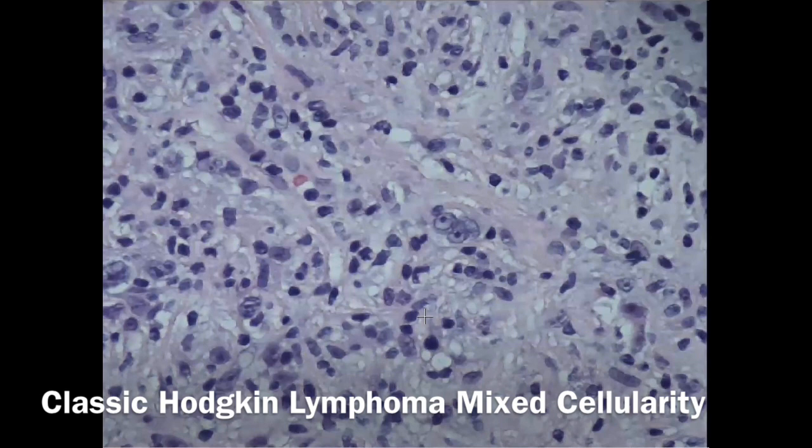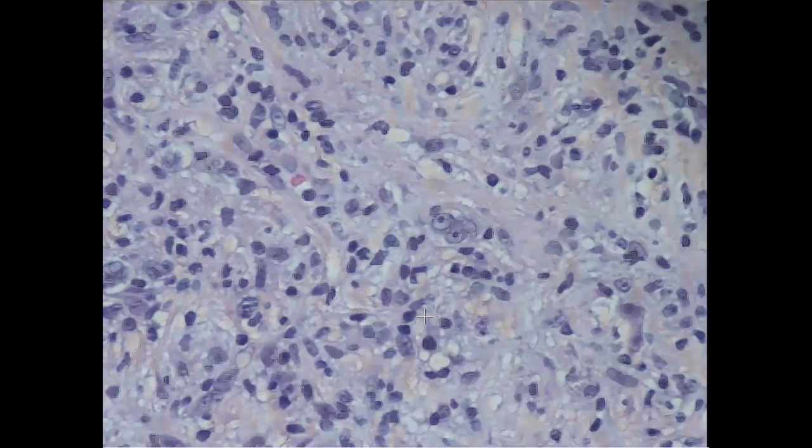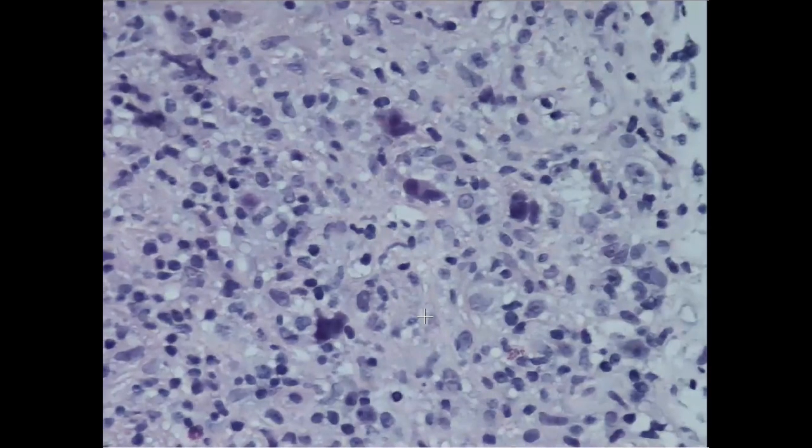And now I'll go with the stains to demonstrate these cells and to see what are the important stains to be ordered in case of Hodgkin lymphoma. Just before we switch to the stains, these are mummified bodies. As you can see, they are very dark and they are scattered in between. So this is another character. And here we have another Reed-Sternberg cell with this perinuclear halo around. This may be considered again a Reed-Sternberg cell with these two nuclei appearing. So let's go for the stains.